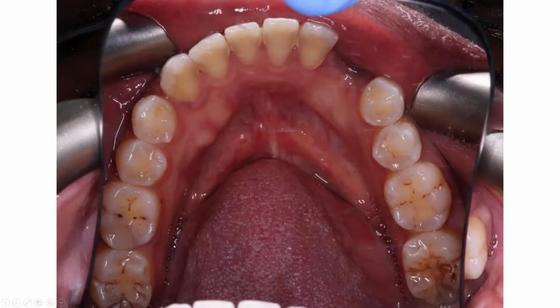And these are all conversations to be had with the patient before you start planning the case and positioning your implant, because obviously in this case we have got some latitude for adjusting the crown, but in other cases you don't, especially if it's an upper incisor, and just 1 millimeter out can have quite profound effects on the patient's aesthetics and phonetics, which are incredibly difficult to correct prosthetically because you have to work to the implant head. And that's most important to remember in these cases, that the prosthodontist is really tied to where the implant head has been positioned, and if the implant head has been positioned in the wrong location, then it can be virtually impossible to obtain a satisfactory prosthetic result.